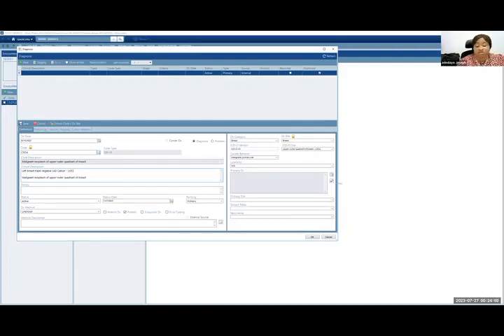So the clinical description is really just what you would write in the physical case files. How would you write this? And if you were having a conversation with a colleague, how would you explain it? You're not likely to be saying malignant neoplasm of upper outer. You're going to say left breast CA, triple negative, upper outer quadrant, and that's what you should write in your clinical description. Now, if you want to add any more details, you can. So you can say things like skin dimpling at presentation, or whatever else detail that you want to add.